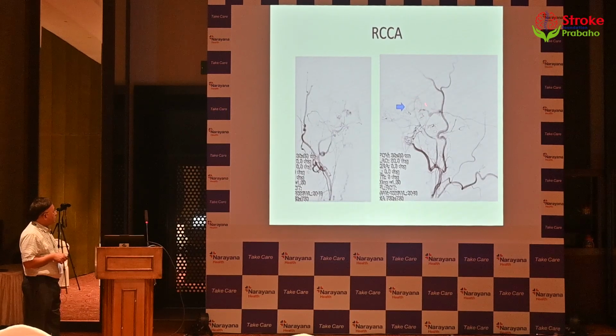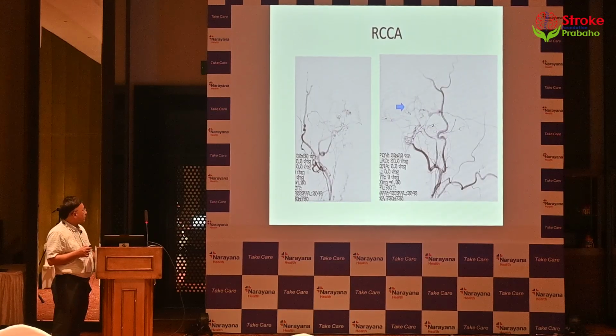So this area does not seem very healthy for a point of embolization, because if you want to do middle meningeal artery embolization, then definitely the ophthalmic artery is there, the falcine artery is there, and the embolization will be very risky in a patient with bilateral carotid occlusion.